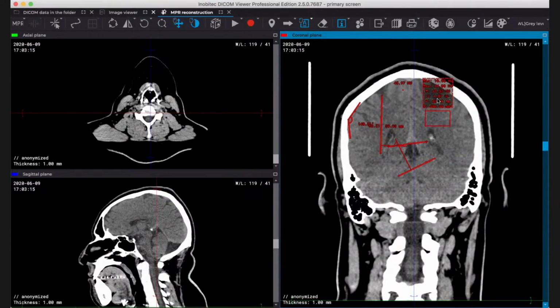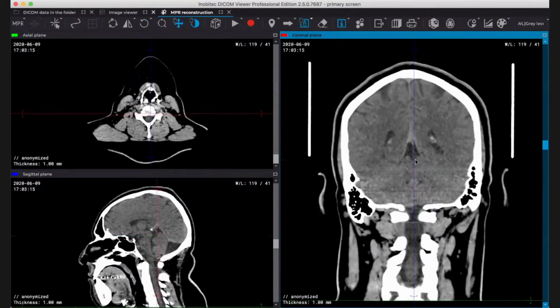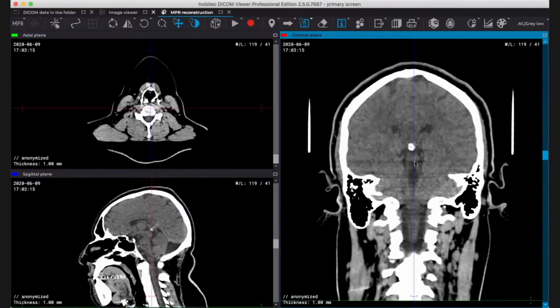Okay, so you can delete it by removing the object. I just did a right click over the object I want to remove, or you can use this one that will remove every measure, okay? So this is just for 2D measuring. Remember that it's always best to measure things and to diagnose from 2D images, and to use the 3D images just to understand the anatomy better, but do measures preferably in 2D because that's more precise.